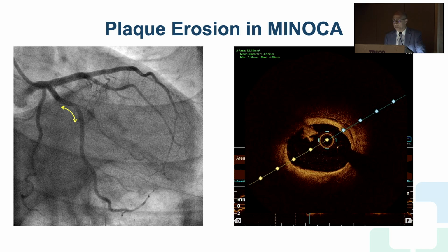So we defined it as plaque erosion. And this is the explanation of this woman's non-STEMI. Plaque erosions tend to cause the myocardial injury by distal embolization. Typically, these thrombi are not obstructive, but they do embolize into the smaller branches downstream.